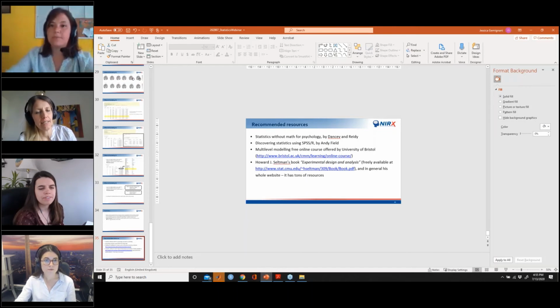This is true in NIRS Lab, where very often, actually almost always, whatever the regressor is, we are now talking at level 1, right? Covariates at level 1. The sampling frequency is not the same as for the fNIRS, so you will never have the same number of samples. And in NIRS Lab, you have to manually resample your data to have the same amount of samples. I'm not sure if the NIRS toolbox gives you tools to resample, or if this has to be done manually.